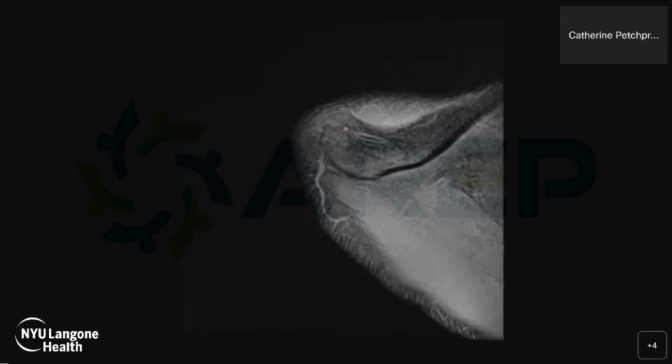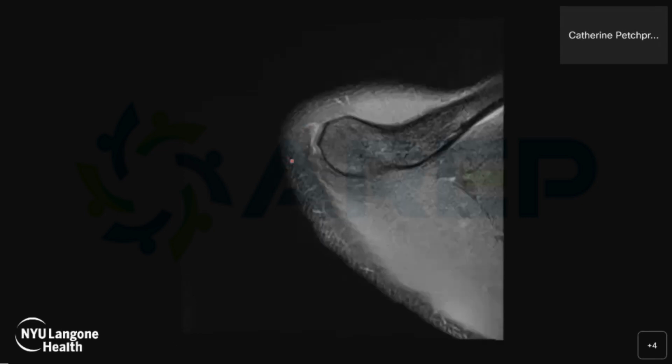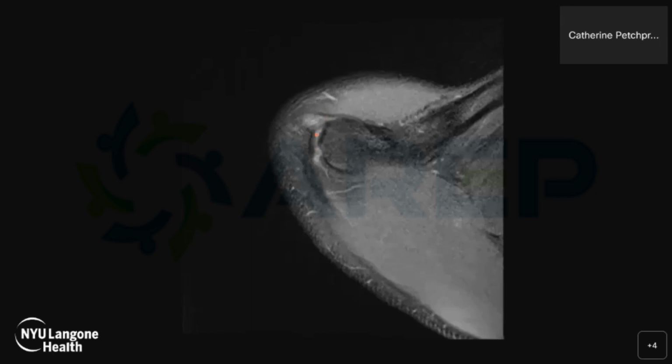Axial plane: clavicle and acromial process at the acromioclavicular joint. Note its alignment, lining up anteriorly and posteriorly.